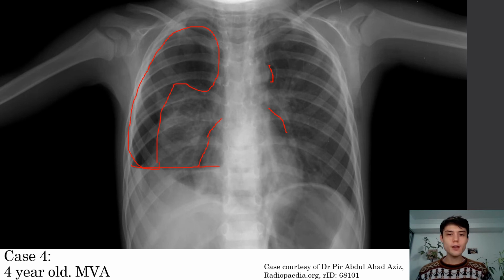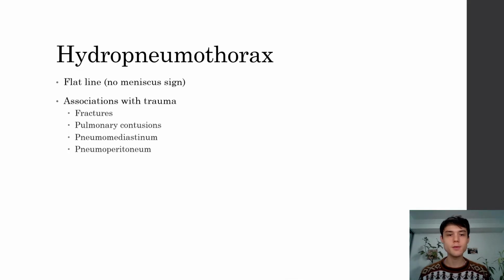So there's been a trauma, and we've got to be looking for fractures as well. But in this chest X-ray, we don't see any fractures. And in young people, it's much less likely to have fractures because instead you'll have bones bending rather than breaking. But that still allows the lung and soft tissue structures to be damaged.